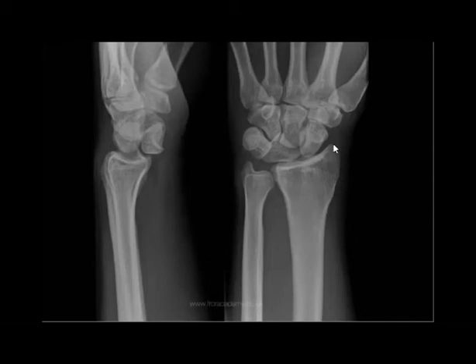Do you remember that the cup, the relationship with the capitate, and the lunate should be in this location? So when you find the lunate away from its site, do you think that's something called lunate dislocation? Yes. Okay, perfect. Lunate dislocation.